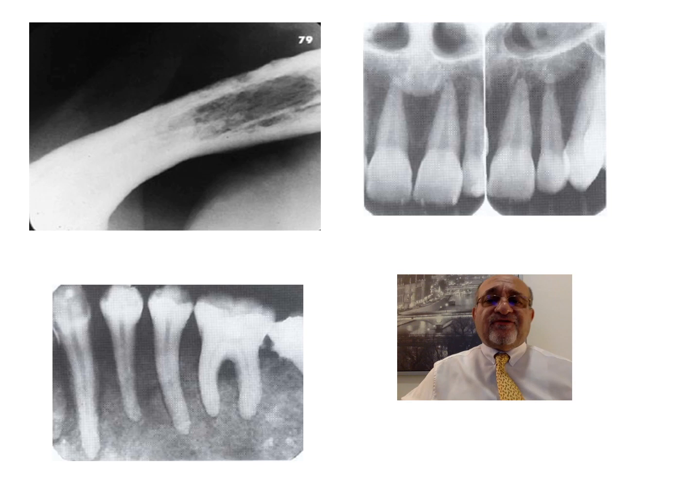Other radiographs. See the lacunae formation in this occlusal radiograph. This is the shadow of the tongue over here. Have a look at the bone trabecules, how thin they are, with the start of the loss of the general outline of the bone.